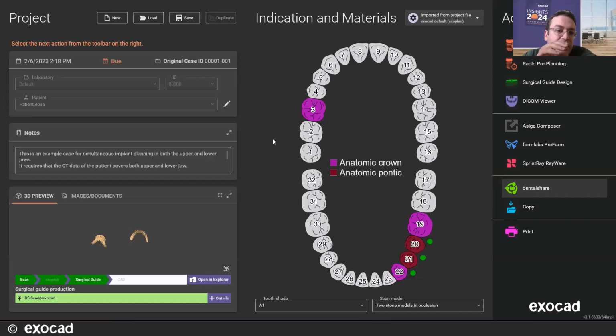The software identifies radiopaque markers on each object, and then merges those together automatically. And then it routes you to the appropriate steps for that workflow. And then for the guide, there's a step that extracts the intaglio surface of the denture, and that's what it uses to design the guide on. So we have a good workflow for that. Yeah, and you have the option to use the prosthetic as a guide or design one like we just did. So you do have options there as well.